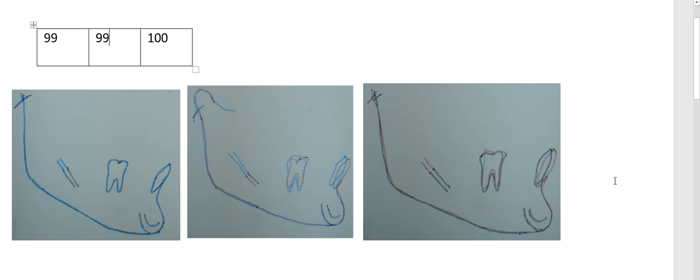So coming back to the superimposition, this was a distalization case. I used a distal jet in the upper arch to distalize upper molars. I placed bite blocks during the course of distalization. In the lower arch, I even went for the bending of lower eights. They were erupted, and to level the curve of Spee, I went for the bending of the lower eights.